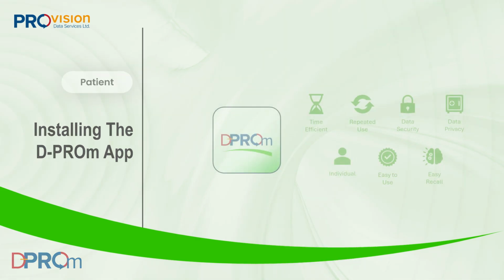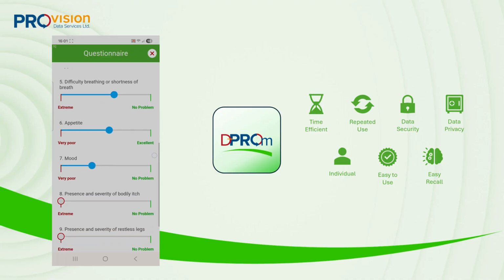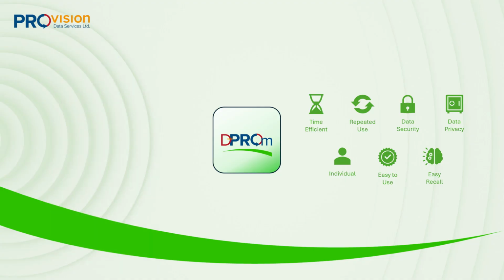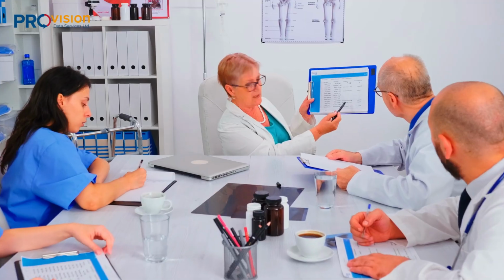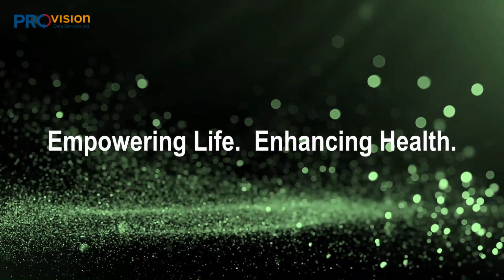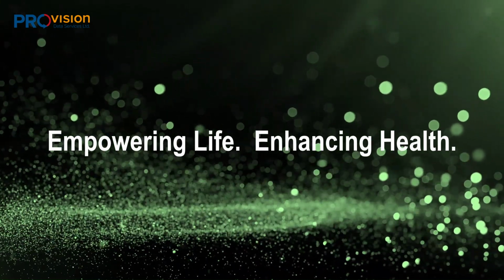That's it. The D-PROm app is now installed, configured, and ready to support your insight reporting. Tap the D-PROm icon to open the app directly. There's no need to open your browser. And remember, regular interaction with the app ensures a two-way connection between you and your care team, clinicians, dietitians, and social workers. By reporting your insights, you are actively shaping your care and unlocking better health outcomes.